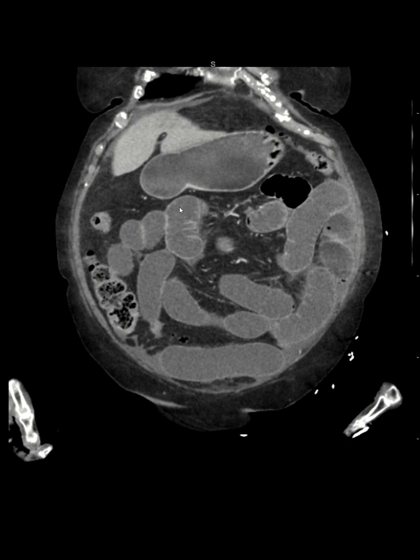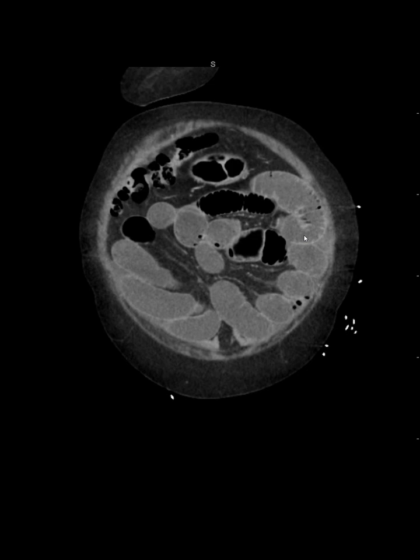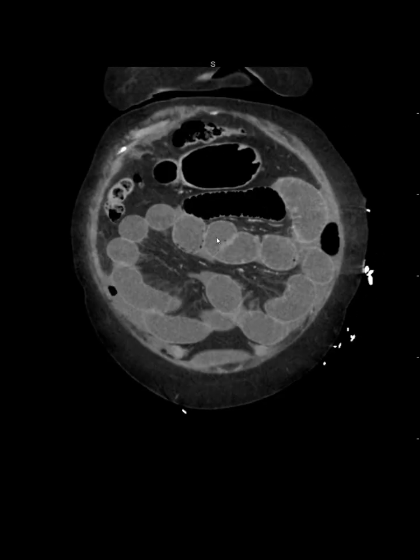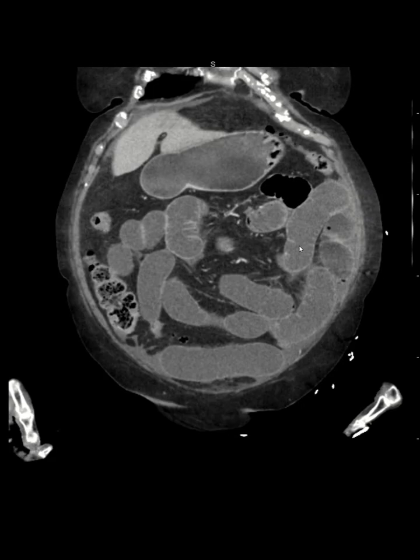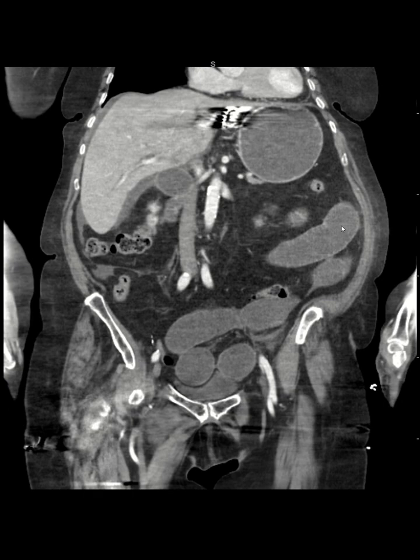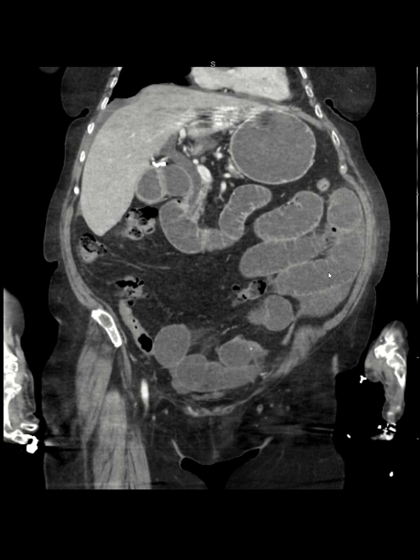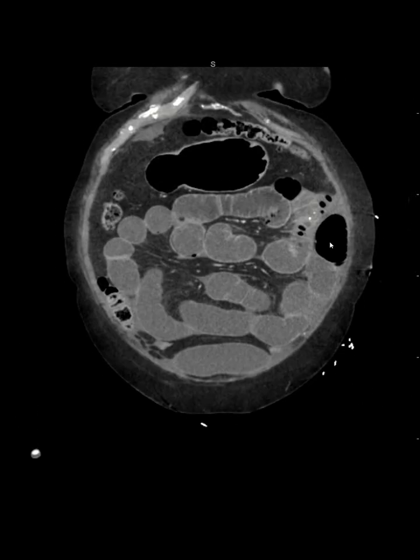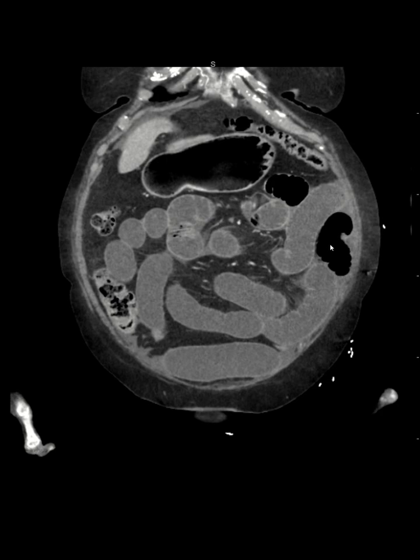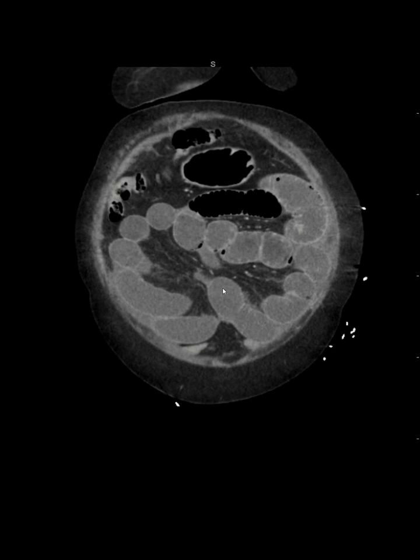right? So the challenge is to go just back and forth along the length of the small bowel to try to go to the transition point. And I want to show you how I do this on this patient because the findings are classic. As we are following these small bowel loops, we find that the walls on both sides are showing enhancement. That means that there is no bowel ischemia or bowel necrosis. The non-dependent portion will have air or gas, and the more dependent portion will be filled and distended with fluid.